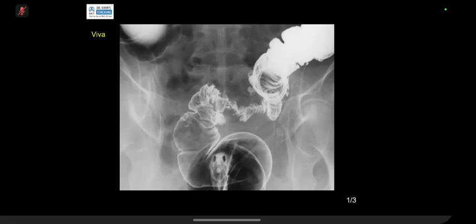So I'm intentionally not showing you many cases because of time factor. One thing is know your pathology and make your radiology. Here is another Arnold Schwarzenegger in diverticulitis. What happens? The muscle, this time the real muscle, the muscularis, becomes hypertrophied. And it gives you a unique pattern. This is a stricture, and this stricture is diverticular stricture, and there is no mucosal destruction.